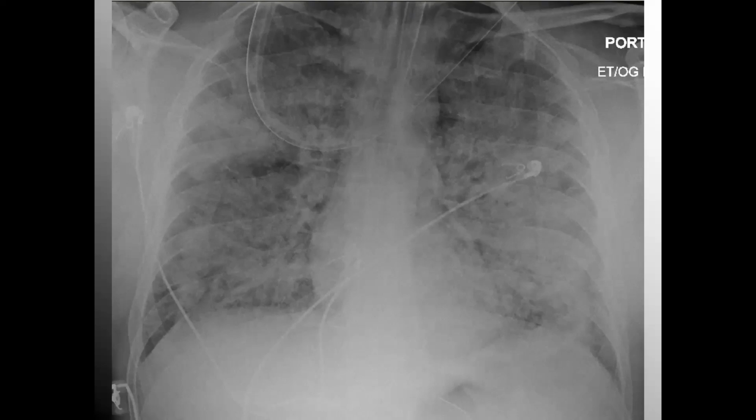Not so much in the neo-peds population. Hey, a couple of centimeters would have you extubated, right? I almost said excommunicated, but if you did extubate a neo, you might get excommunicated from RT for that day. But let's look at our film here. Take a moment, go through, use a systematic approach on your own here for a few moments.